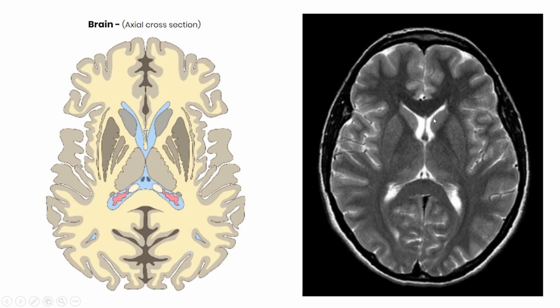But this is part of the deep set basal ganglia, as well as the putamen, and this is easily seen here, this triangular shaped piece, or almost kind of like a sail, I guess, on either side. And then you have the internal capsule. So you have the anterior limb, and then the genu and the posterior limb of the internal capsule on the right, and the anterior, genu, and posterior limb of the internal capsule on the left.